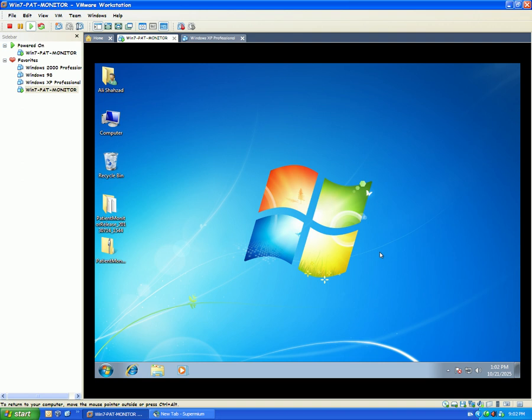This is Art, and in this video I will show you about the patient monitoring software, which is the simulator, and this is my second video discussing it. When you first download the file from the internet, I will show you a link to download it. Once you've finished downloading it, you'll find the file in your downloads folder, or you moved it to your desktop.